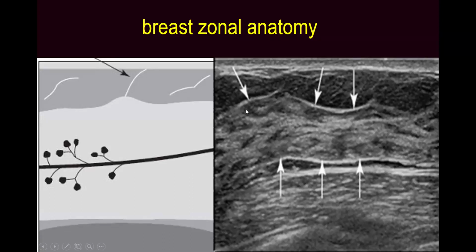This is an ultrasound image, fortunately representing the anterior and posterior mammary fascia very obviously. Can you see the hyperechoic layer here, anterior to the mammary zone, and the posterior layer here, the retromammary fascia, and the pre-mammary fascia, or the anterior mammary and posterior mammary fascia.